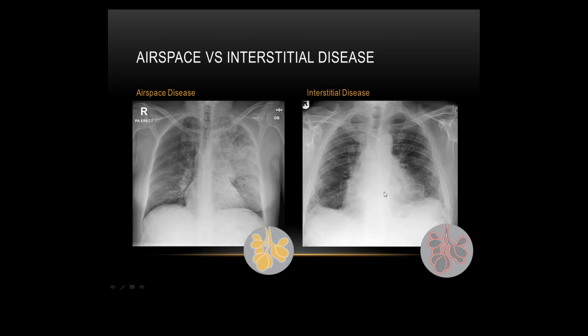And so that should feature in cardiac failure. Then when you come to pulmonary edema, you want to be looking for your Kerley B lines. Kerley B lines are the sign of interstitial pulmonary edema. But obviously once that interstitium reaches threshold pressure, it will start to spill into the alveoli. It then becomes an alveolar process and you'll see the consolidated picture.